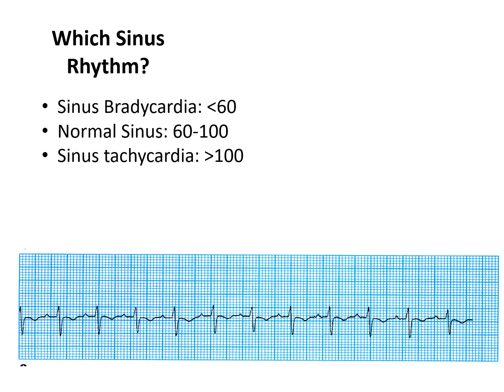Of course, there are three different sinus rhythms, and which one you're dealing with depends on the rate. Sinus bradycardia occurs when you have a regular sinus rhythm, but its rate is less than 60. That is, it is less than the normal rate at which the SA node wants to fire. Normal sinus rhythm is the regular sinus rhythm with a rate between 60 and 100. And sinus tachycardia is when the sinus rhythm is at a rate higher than 100, but less than 150.